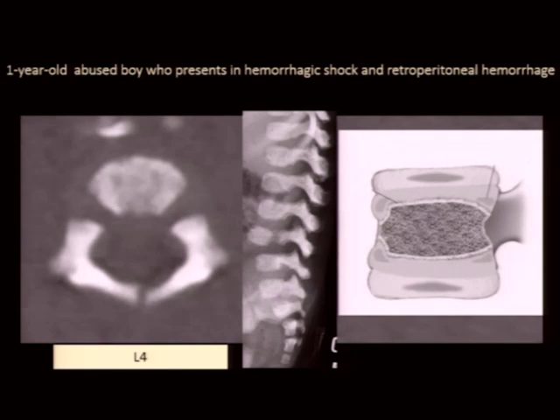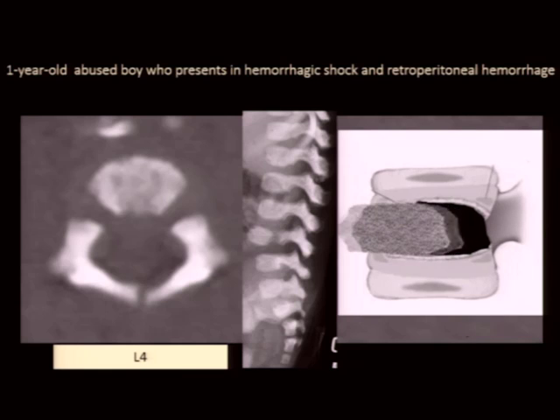Note that if you have this kind of arrangement, you're also going to have fractures. You can assume that they're fractures through the growth plates, right? Because there has to be some disassociation, and the weakest point is usually the interface between the vertebral body and the growth plate.